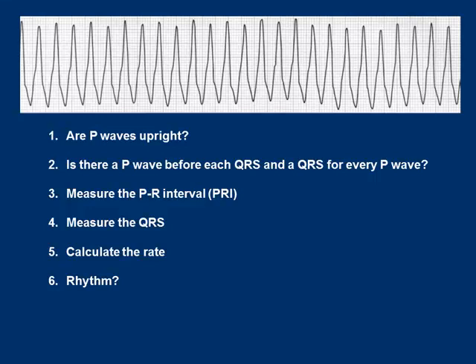So really what tells you about the stability of the patient is, are there QRS complexes? Is the ventricle pumping? I told you about that snarky little nurse and atrial rhythms versus ventricular rhythms. It's a nice shortcut that if the QRS is narrow, then you know the ventricle's okay, and therefore you can have some time to figure out what kind of dysrhythmia you have. But I don't want you to get the impression, just because we're looking at the P wave first, that the atrial is the most important. Truly, the ventricle, the pumping chamber, is the most important.